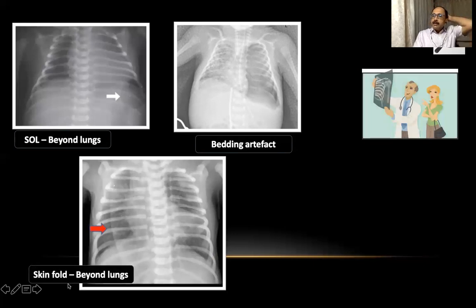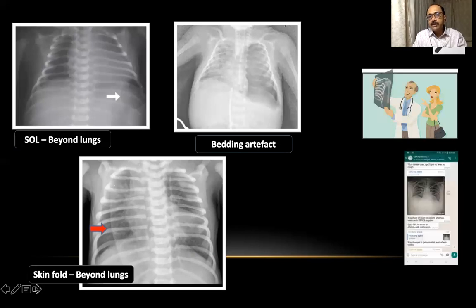What it means here is that time and again you would be missing subtle findings, or you would not be able to come to a clear diagnosis unless and until you develop a habit of having a structured and organized approach, looking at the clinical picture of the baby first. More importantly, try to avoid making an impression on your colleagues by looking at the X-ray in sunlight, because you would be missing many features.